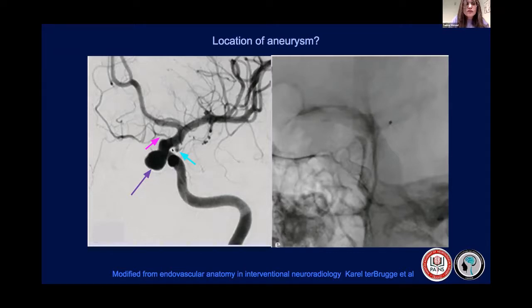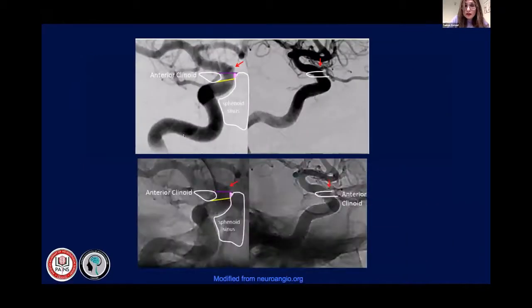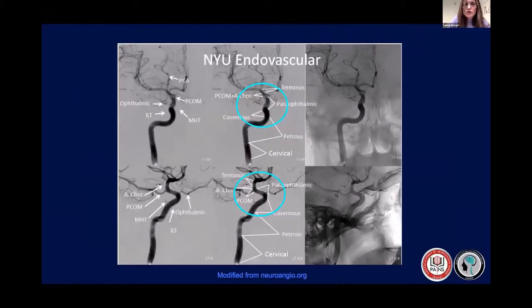Now I want some of you to tell me about these branches. We have talked enough about these branches. Yes. So on the medial side, ophthalmic. Below the ophthalmic, carotid cave. Opposite side, posterior communicating, and above, anterior choroidal. Again, to reinforce the same concept, this is the unsubtracted and subtracted image. So for the rest of the segments, we go back to our same picture.